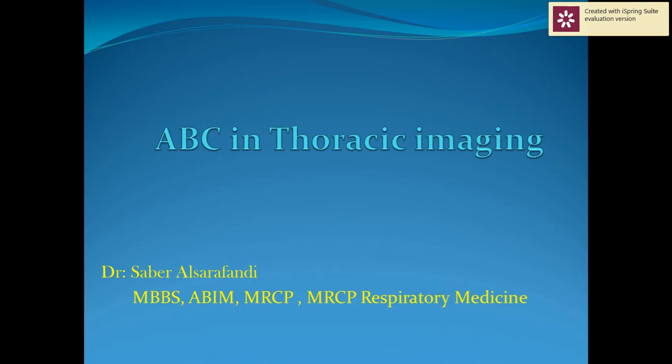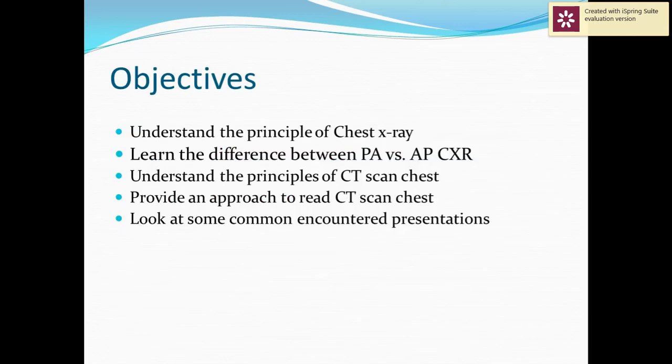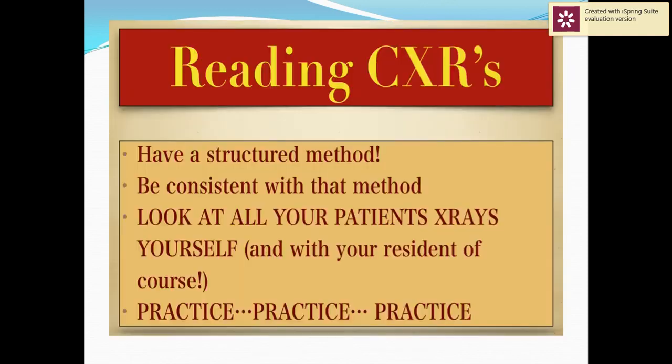Today إن شاء الله حنتكلم عن ال ABC in thoracic imaging and how to read the chest X-ray. First of all, I have no conflict regarding this talk. Our objective today, inshallah, will speak about the principle of the chest X-ray, how to differentiate between PA, AP view, the principle of some encounter presentation, and how to read the normal and abnormal chest X-ray.